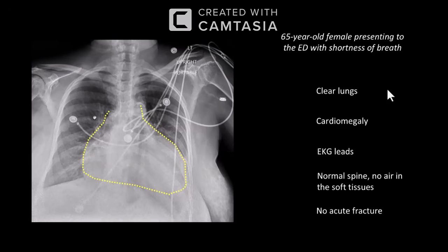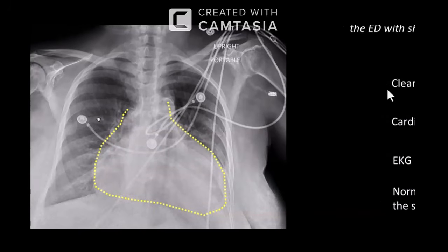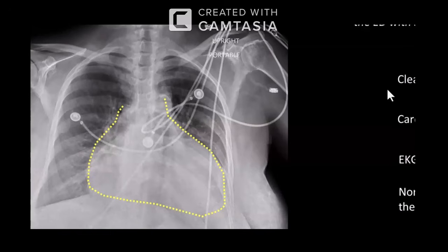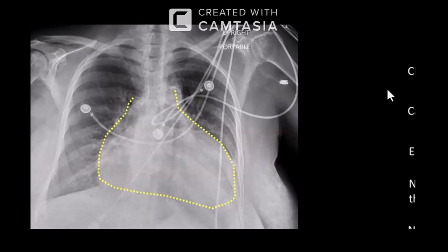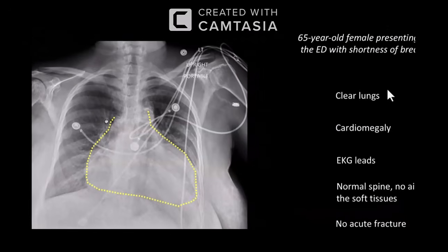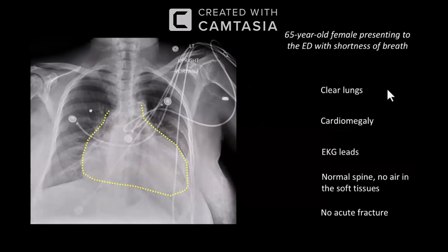I'm not able to appreciate the rib fracture. I think you mentioned somewhere, but I'm not seeing any. Sorry. Yes. Maybe the right posterior, just over the scapula. Maybe that's odd. The sliding scapula sometimes mimics a kind of fracture or interface. All right. So apart from that, there is nothing that we could see.